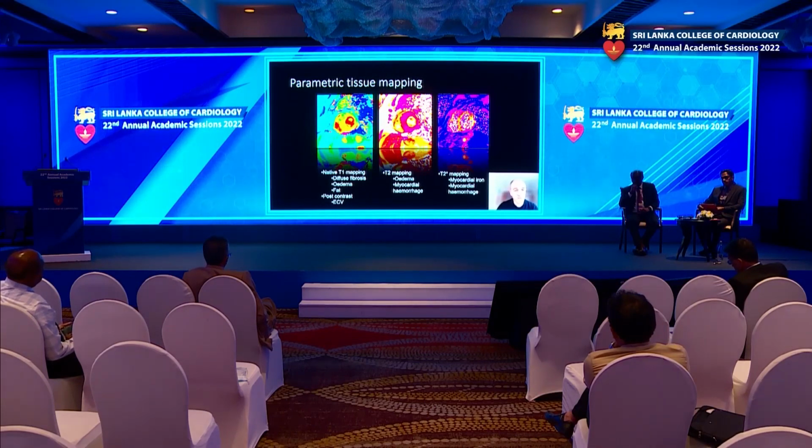For MR, T1 mapping, and this is a T1 map showing the T1 signal for individual pixels within the myocardium, is a marker of myocardial fibrosis and expansion of the extracellular space. We will see that T1 values go up with increased fibrosis. It will go up if there's increased tissue fluid, but it will go down if there's any evidence of myocardial fat, as T1 relaxation time will be shorter. In contrast, T2 mapping is very sensitive to water and therefore is a very good sequence for looking at myocardial edema. T2 star mapping is another relaxation parameter, which is very sensitive for myocardial iron deposition. I'll talk about that a little later when we move on to iron overload cardiomyopathy.